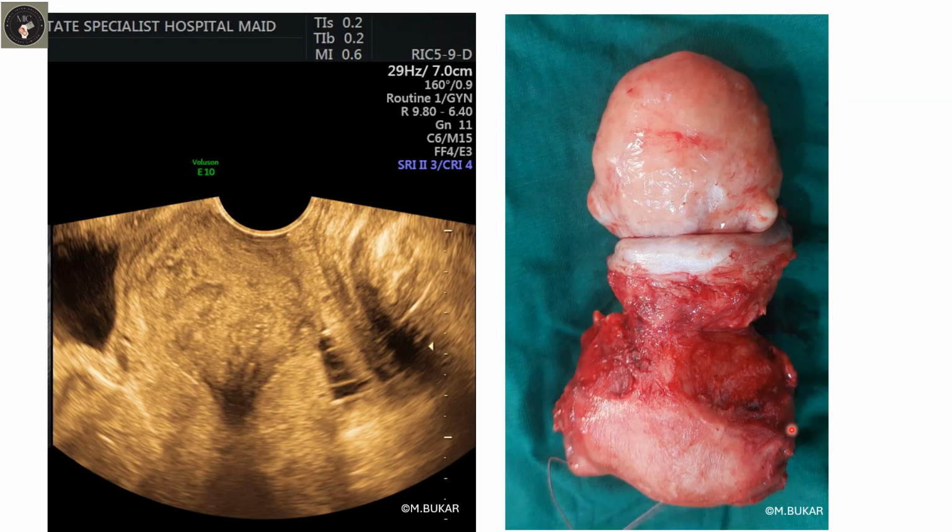So she had TAH with preservation of her ovaries. So here, remember, bladder, anal canal, rectum, well circumscribed lesion in the cervix, covered in the vagina, anterior lip of the cervix, posterior of the cervix, cervical canal. I have turned this upside down because that is what transvaginal image is all about. You assume that the patient is in an upside down position. So if that's the case, look at this. Well circumscribed lesion here. Well circumscribed lesion here. The cervical rim here. You can see here the anterior, posterior, and of course, this is the endocervix. The uterus is not defined here.